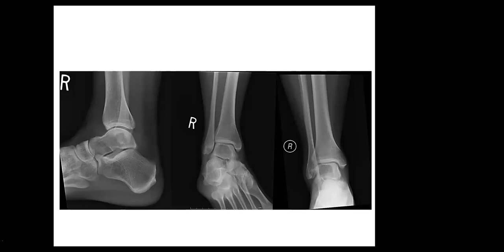Slightly widening the joint space. Decrease bone density and a lucent lesion involving the talus bone. This is what I see on the X-ray. It seems to be with a well-defined narrow zone of transition.